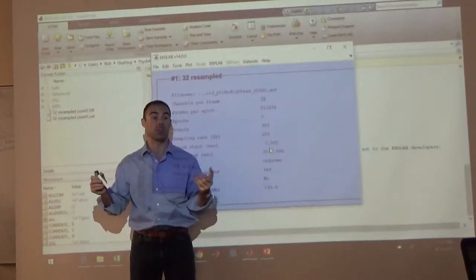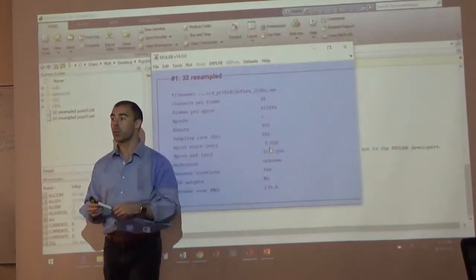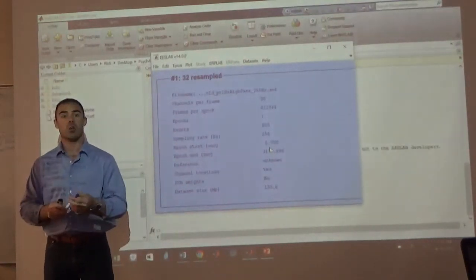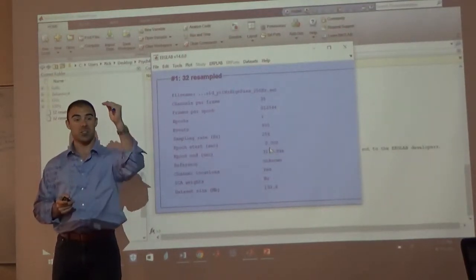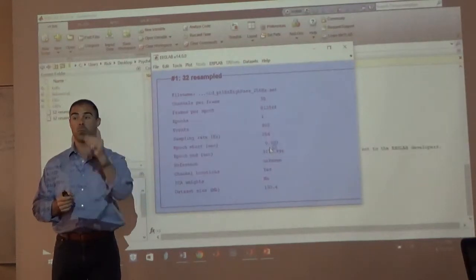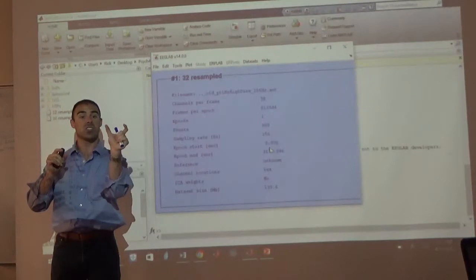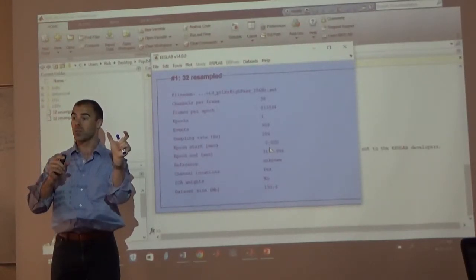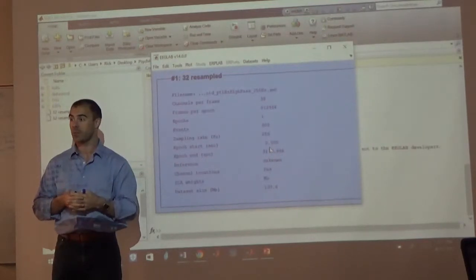Now, ERPLab calls that an events list, right? So, what this means is that, remember all of our combinations? Remember there are 75 combinations of events that we said? You have 61, 62, 63, followed by the item judgment and the source judgment. That made a 4-digit number that there were 75 possible combinations of. Everybody remember we talked about that?